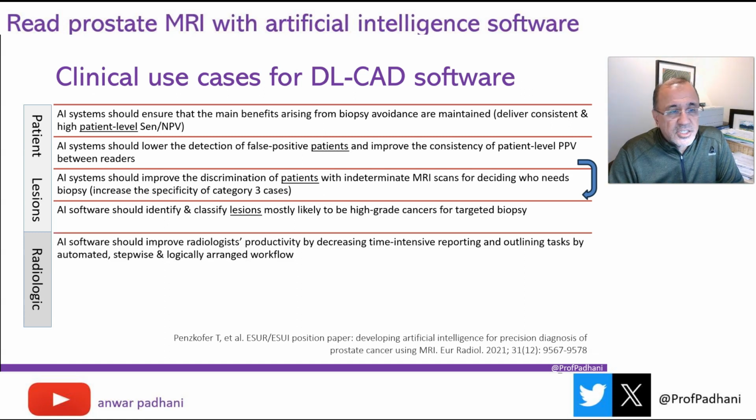For the radiologists, the AI software should increase productivity and decrease some of the time-intensive tasks of reporting, particularly the outlining functions, by automated, logically arranged, and a stepwise workflow.